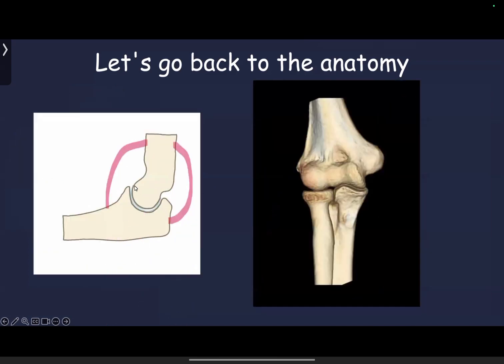So in a nutshell, we have this anterior and posterior muscle. In between the joint, we have this blue articular cartilage. In between the articular cartilage, you have the synovium, which secretes the synovial fluid. Then we have something called the lateral synovial fringe. This lateral synovial fringe is like a meniscus, which will dip into this joint. Then outside we have the capsule, and the outermost structures are the collateral ligaments from the medial and the lateral side. Then we have the fat pad present anteriorly and posteriorly.